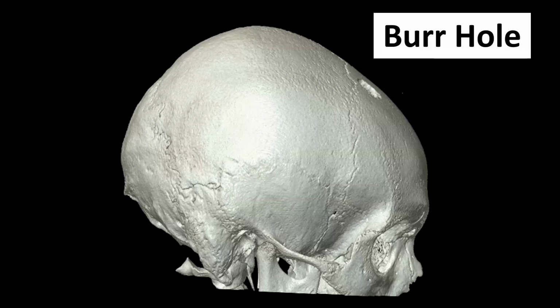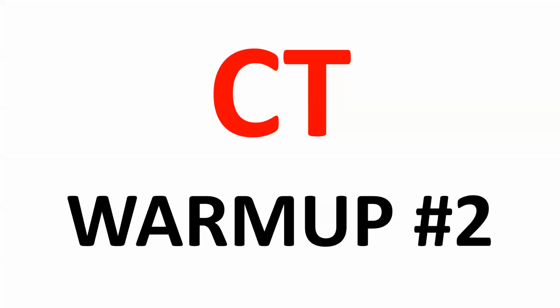All right, anyway, okay, let's let that go. Okay, you know what? I know that I made that a little more difficult than it was, but it was so simple, burr hole. I think we have to up the game with the CT warm-up. Don't you agree? That was not quite an adequate CT warm-up, so I'm going to give you a second chance to play CT warm-up number 2. All right, this is going to tell the story.